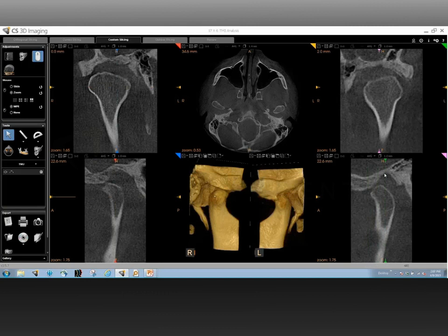And there you go. You see the first change over here. You notice some sort of flattening. In fact, you can see on the lateral side, you can see on the superior head, there's actually quite a bit of loss of cortical bone there. And then as we go further lateral, you can see a remarkable indentation indicating possibly a very chronic degenerative disease, osteoarthritic disease on that side.